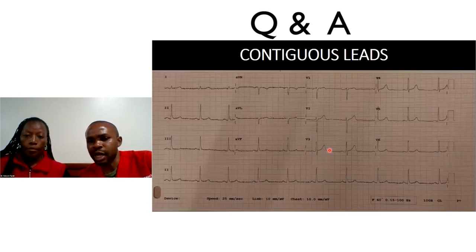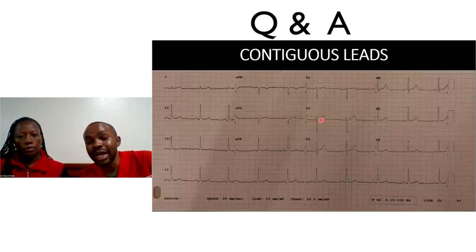So we picked a number of issues with T waves. One, the direction in which they are facing. So for example, if here you start seeing it's not upward anymore, it's downward facing, then you ask yourself what's going on. If you find this T wave is so upward facing, and in this presentation, we did not put a lot of pathology because that was not the focus. We'll do that next time. But peaked T waves, or what we call tall and broad-based T waves, those are pathological. And as primary caregivers, we have to ask ourselves what is going on.